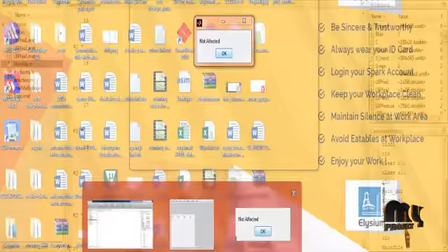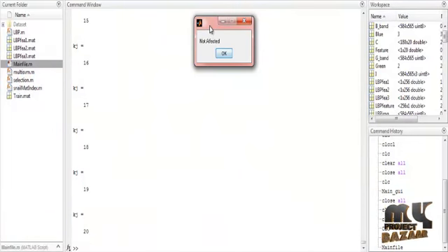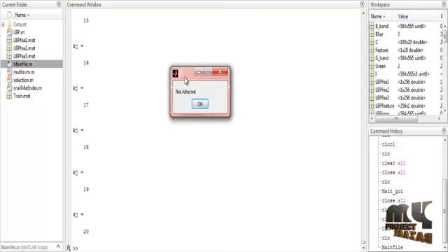Finally, the classification. In the classification process, we are applying the SVM classification. By using the SVM classification, it is determined that the fundus image is not affected. Finally, it is shown in the message box: the fundus image is not affected. These are the overall running procedures for the process.